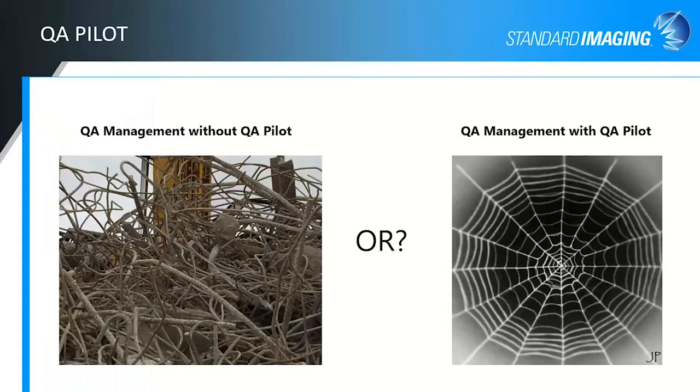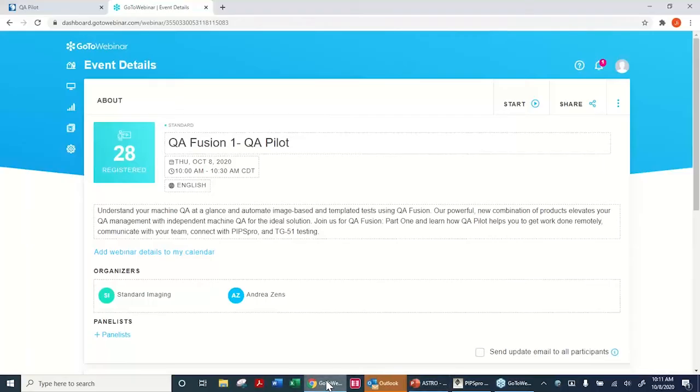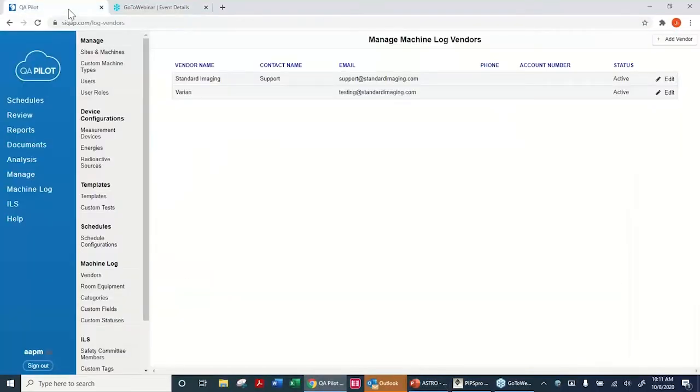So I like to think about, and I've heard, because I've had discussions for a very long time with physicists, about what a mess, how out of control things can feel when you don't have a management tool. QA Pilot really helps you see the intricacies, the connections between what's going on with LINACs and your centers and individuals and different people covering different things. Again, in this day and age of working remotely, that overview is very important. So now let's go take a peek at what it is that we're talking about.